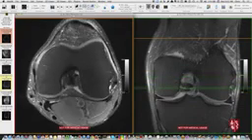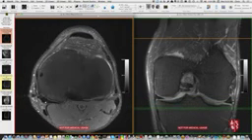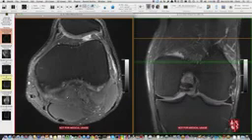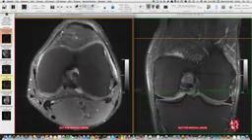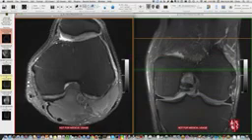Okay. Then we look at some miscellaneous things. Say we've got a good diagnosis. Is there fluid in the region of a Baker's cyst between the medial gastroc and semimembranosus? Is there fluid around these tendons, these pes anserine tendons? Looking at the popliteal fossa, look at the gastrocnemius muscles on either side. You could see injury in those, but mainly we're just checking to make sure that the vessels make it through without any kind of deviation or possible entrapment by the muscles. And then the nerves are also here. So this is the tibial nerve and the common peroneal nerve there on the axials.